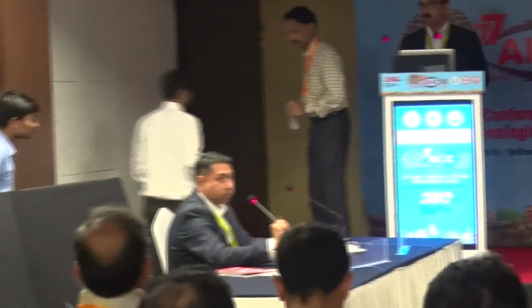Thank you, Dr. Manoj. So we'll take the questions towards the end. I think we have time. Any questions to Dr. Manoj regarding multicolor imaging?